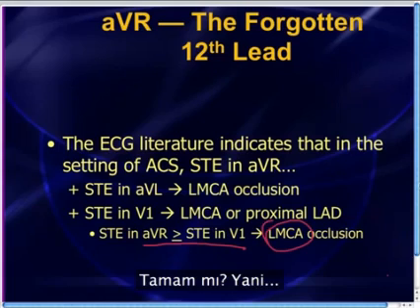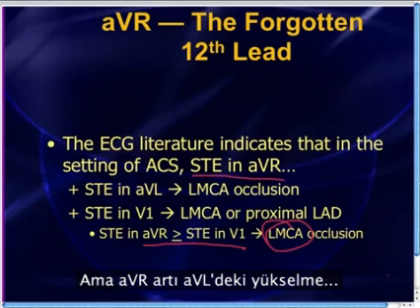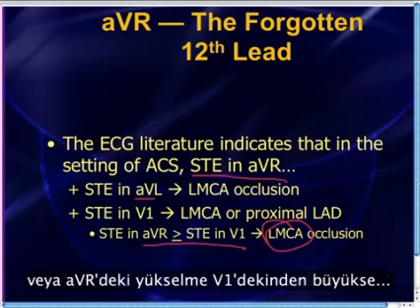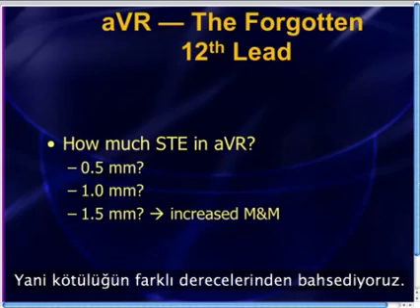All right? So, elevation in aVR by itself is bad, but elevation in aVR plus aVL or elevation in aVR greater than in V1 is really, really bad. All right? So we're talking about different degrees of badness.